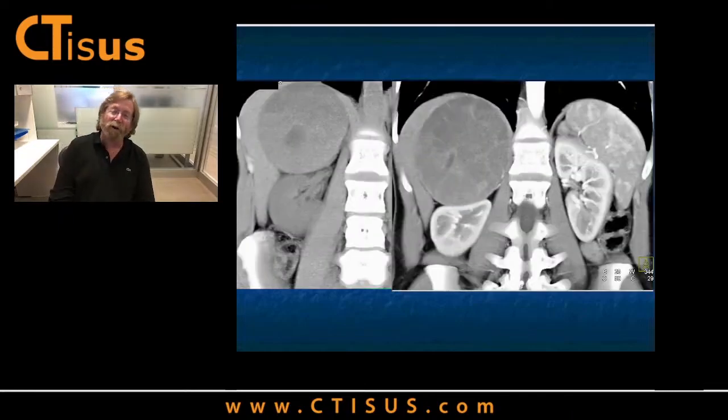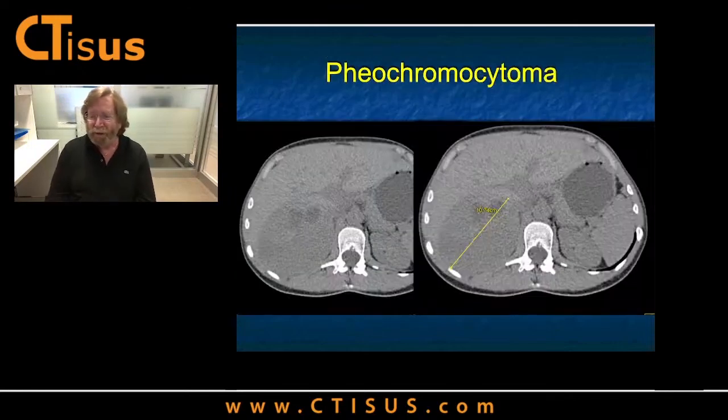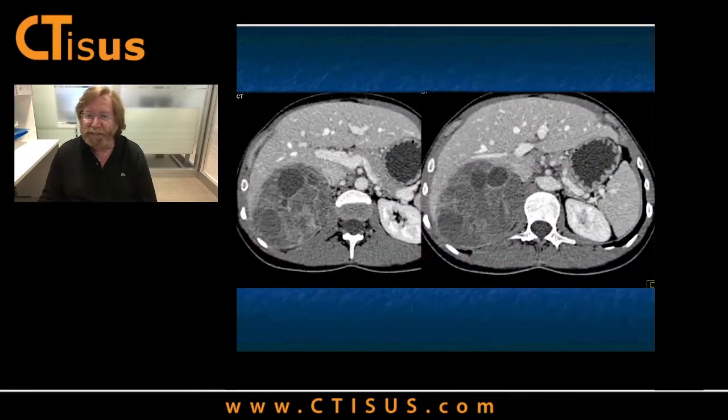What has given me a large, well-defined solid tumor? I showed you a few cases, so I want to show you the whole spectrum. I showed you Mets, it's a possibility. I showed you ACC, it's a possibility. But lymphoma, I just don't like it, but I guess it could be. Well, what did this end up being? Pheochromocytoma. Pheos can be large, they can be cystic, they can be vascular. This lesion had a little of everything.